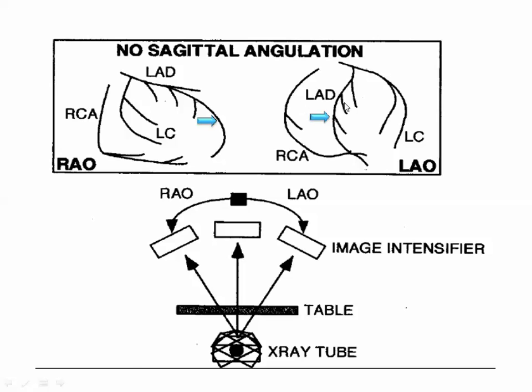What is this view? Here is the spine and the shaft, LAO. So the walls are septum, anterior, left lateral, inferior. What's supplying the septum? Yes, LAD, and here will be the septal perforators. Here and here will be diagonals, and here septal perforators, but it's all overlap.